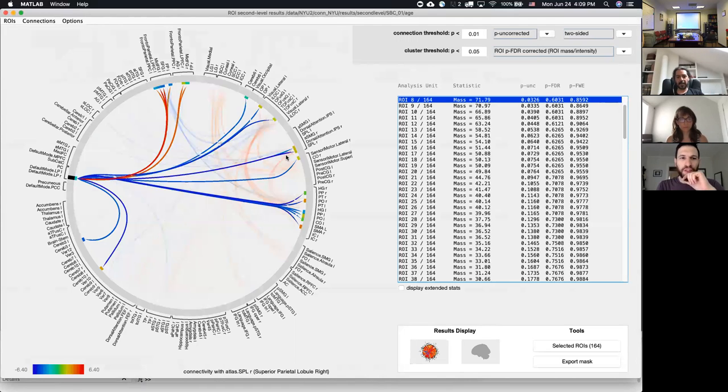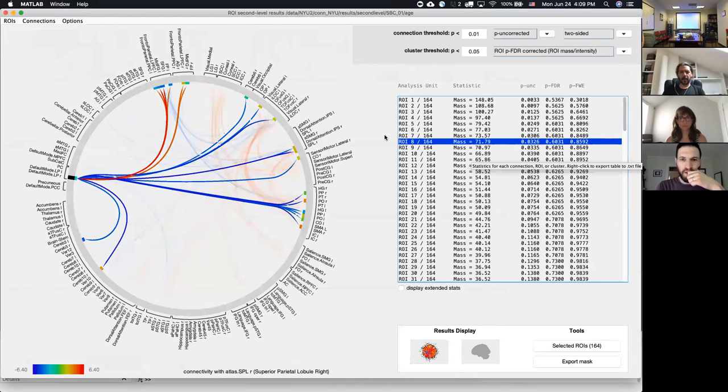So my question was not necessarily about whether it's bidirectional between ROIs, but whether the significance of that connection, of that ROI to all other connections, depends on positive and negative connectivity. Right. No, it's grouped together basically. All of the connections, as you see here in this example, in red are the positive connections, the ones showing the positive difference. Let's say I'm looking at correlation with age. In this case, positive means positively correlated, so these connections increase with age, and negative means that these connections decrease with age.